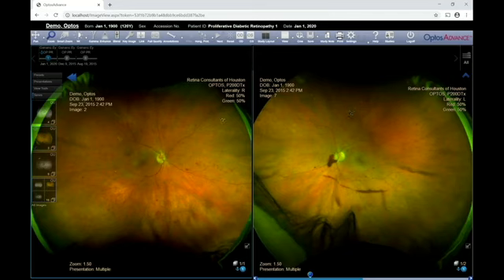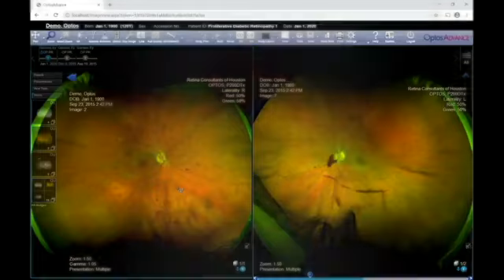You may use the toolbar for image manipulation. To use the toolbar, select the function you want to activate, and the left mouse button will control that tool. It will remain in that tool until you click back on Zoom. For example, clicking on Gamma will enable the left button of your mouse to brighten or darken an image. Alternatively, there are mouse and keyboard shortcuts that streamline the image review process and eliminate clicking on and off the toolbar. We will now review the use of those shortcuts.